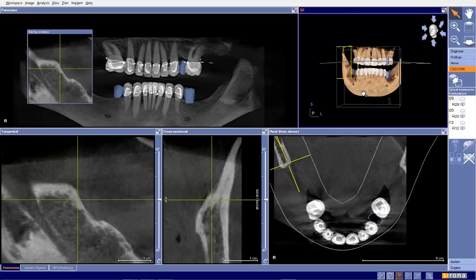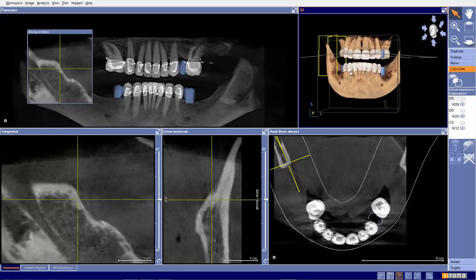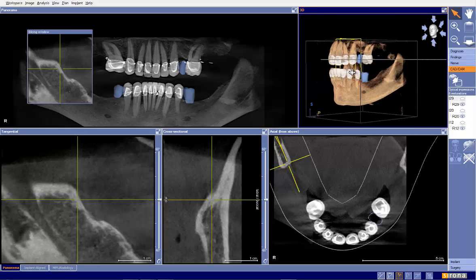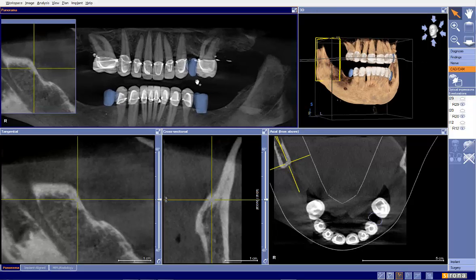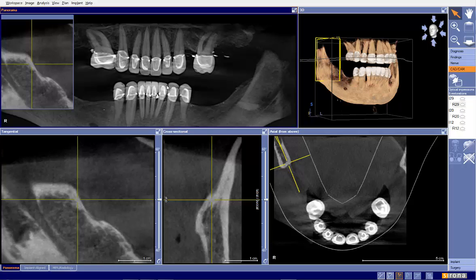Okay, we've been sent a case to evaluate a couple of different implant placements. As it looks like from here, you can see this patient has had a lot of dentistry done, and we're all very appreciative of patients that have a lot of dentistry done. So my first question when I look at this particular case, what is our initial assessment in terms of surgical guides?